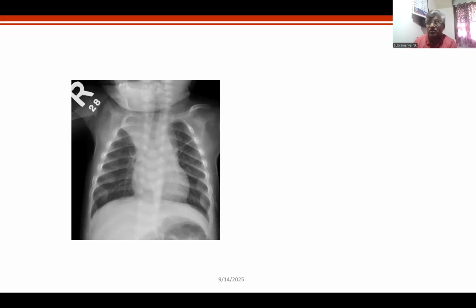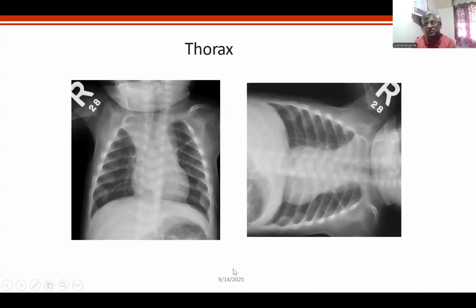Now here, I was not bothered about either the collapse or the consolidation. I was worried about what you missed. I will just show you the next click. You will have the answer. All of you will have the answer. I will not speak. Now tell me what's your diagnosis. Anybody?